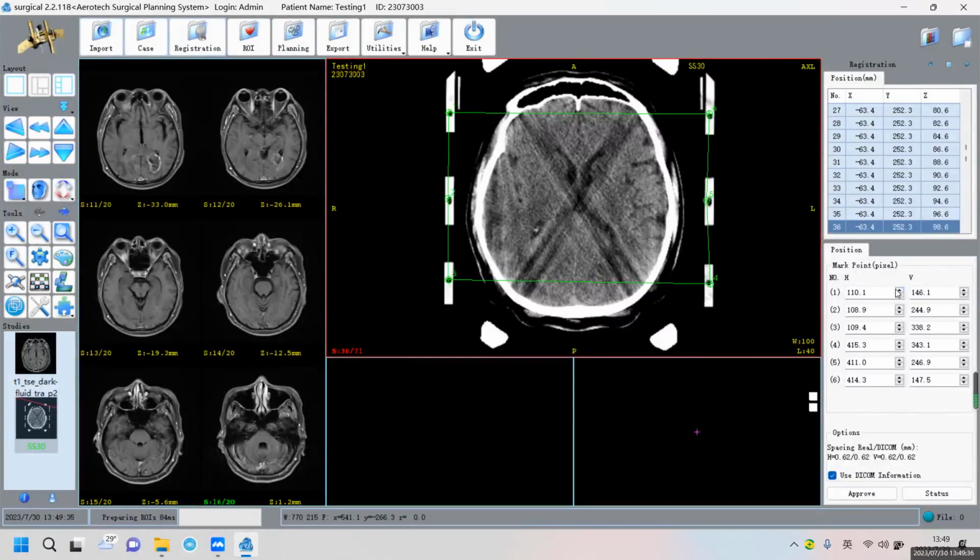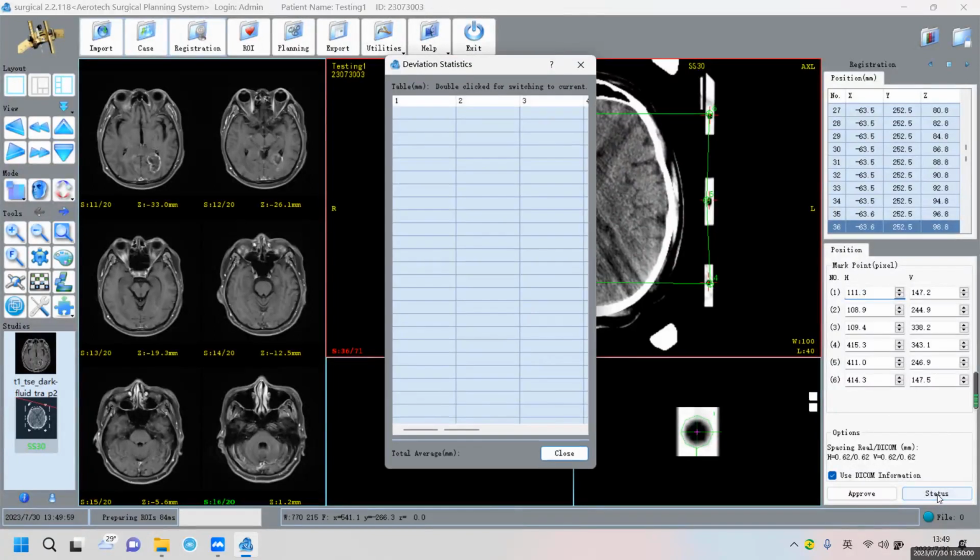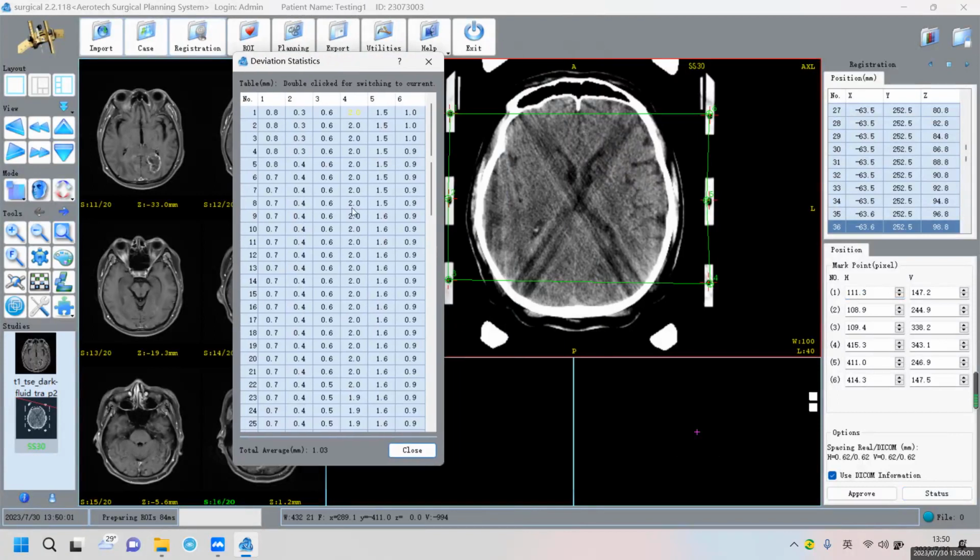The left area is to do the adjustment left and right, and this area is to do the adjustment up and down. The principle is to make sure that each mark point is in the middle of this black hole. And we can see here we have a status. We can open it. Then there is a number. The smaller, the better. Now we have already fixed the fine adjustment of 0.1. Now turn to 0.2.